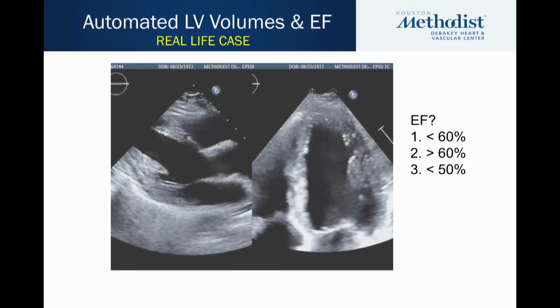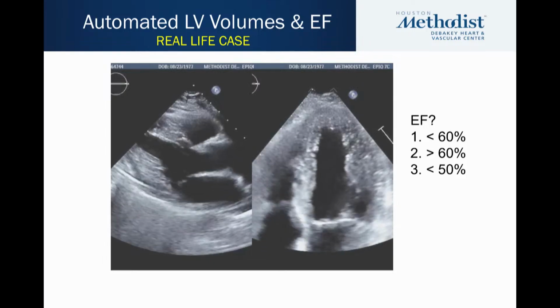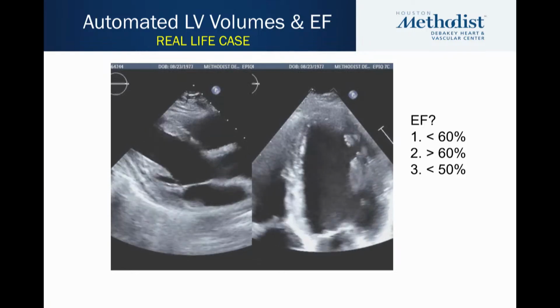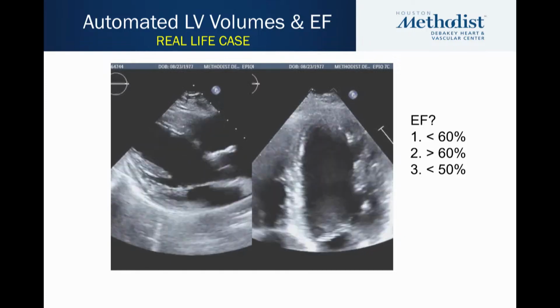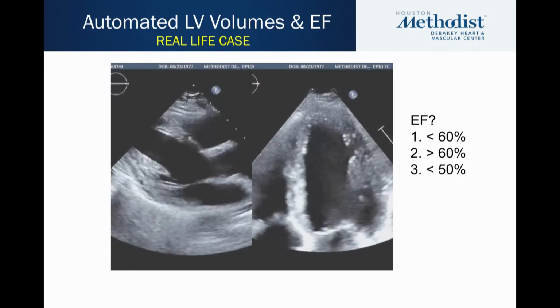This is a case from our lab. We have lots of these every day. Image quality, good. Eyeball, what do you say? 60 or more, less than 60, but greater than 50 or less than 50? 60 or more, right? Everybody agrees? I mean, yeah, looks, all right.